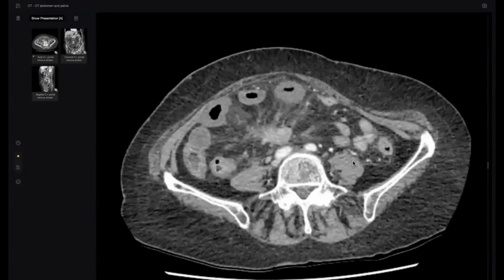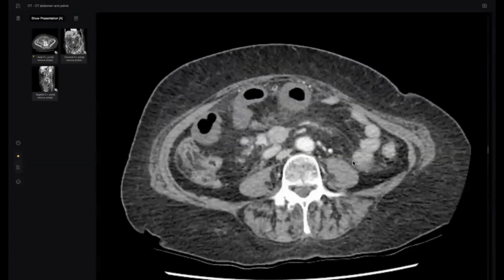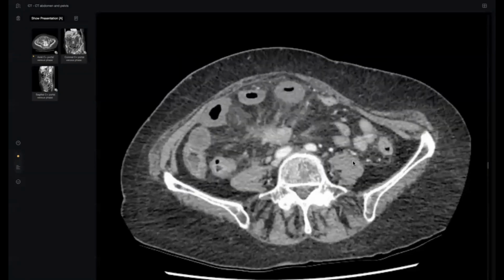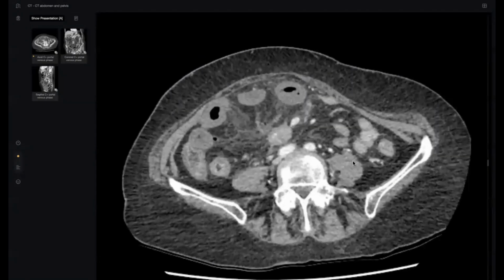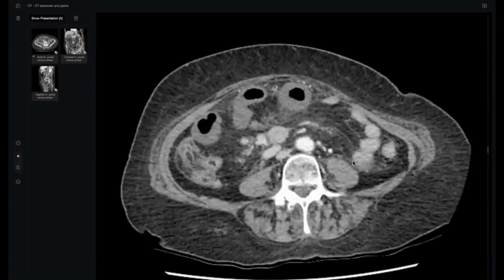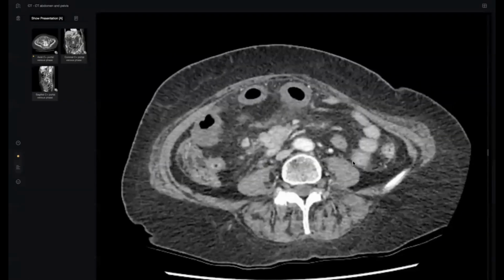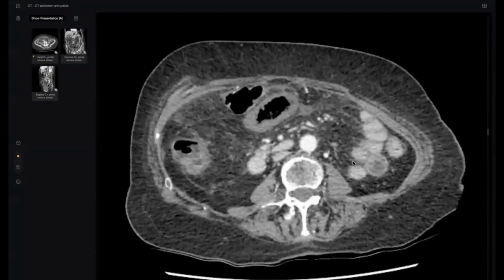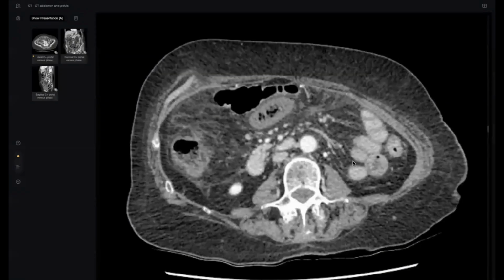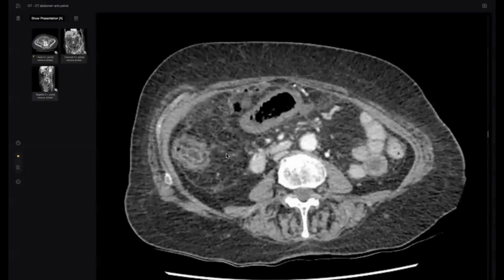Doctor, this mass is irregular, surrounded by some lymph nodes, and it has spiculated margins extending to the bowel, tethering the bowel. The bowel is dilated, thickened, and hypoenhancing. I have a big doubt of ischemia, so let me check the mesenteric vessels. This is the mesenteric vessel, both of them. You should follow them, especially as this is a small bowel.